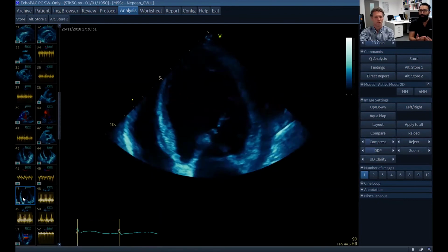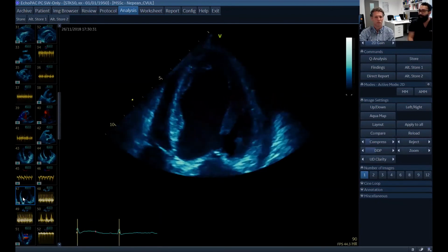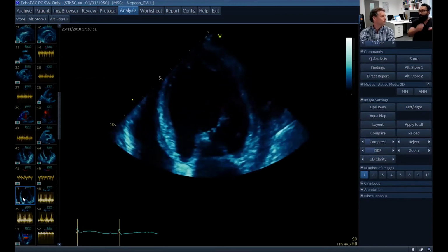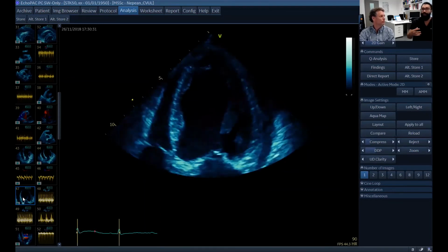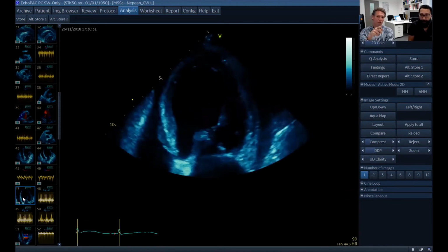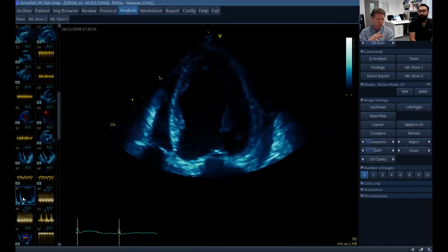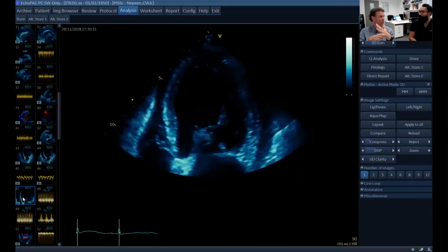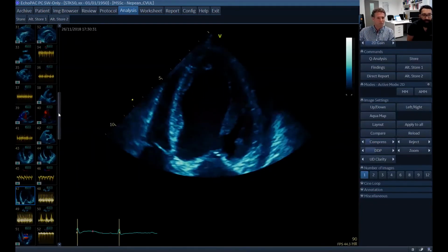But if you've got a big dilated LV, then your LV EDPs are already very high, and you may have fixed elevated left atrial pressures, meaning that respiration may not modulate it to the degree you'd expect in people with less of a restricted filling profile. And maybe we could also say the same about the RV free wall collapse. If you've got significant pulmonary hypertension, which I don't think this patient does have, you sometimes don't get that RV free wall collapse either, but you can still have issues with obstructive flow.